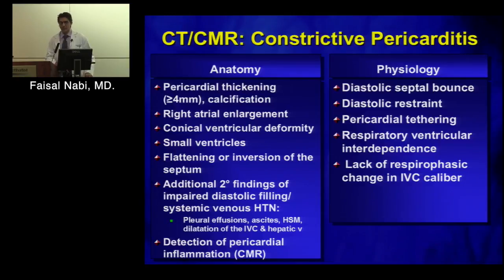Remember, on the order of 40 to 50 milliseconds. We have a technique called real-time imaging, and I'll show you some of those images, where you can actually see the hemodynamic response of this heart to a thickened pericardium, much like you could with transthoracic echo. So we can see some of these things that you have seen with echo, as Gopi demonstrated to you.